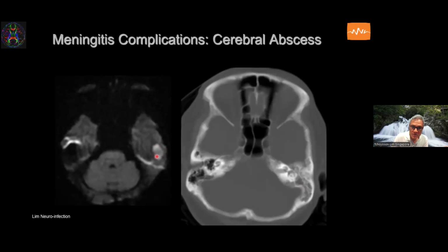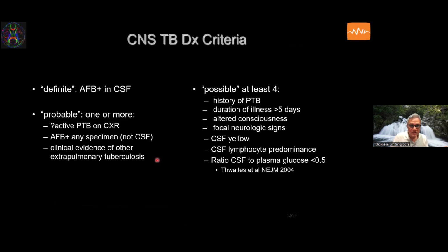And here you can see the diffusion weighted MR image, which we recognize here as very low resolution, 64 by 64 matrix, and the increased susceptibility artifact at the air-bone interface, making this lesion a little bit difficult to perceive, but you can see that there's high signal on DWI in this pus collection caused by cerebral abscess.